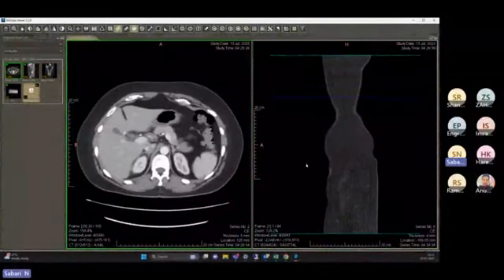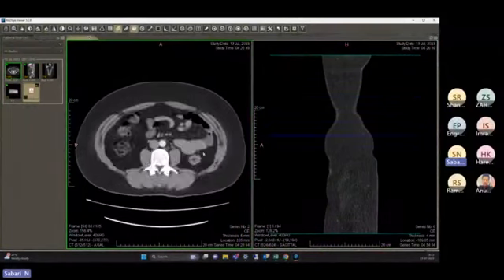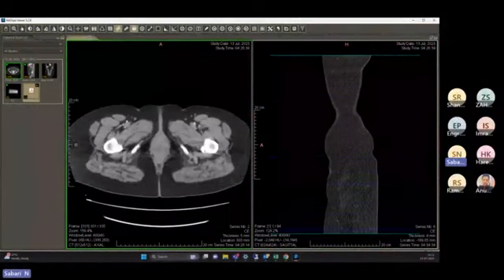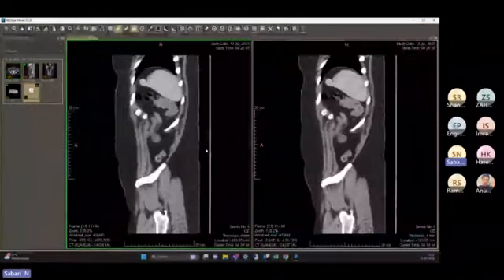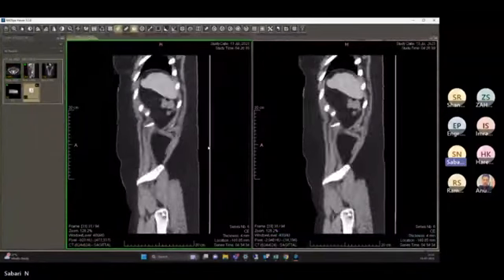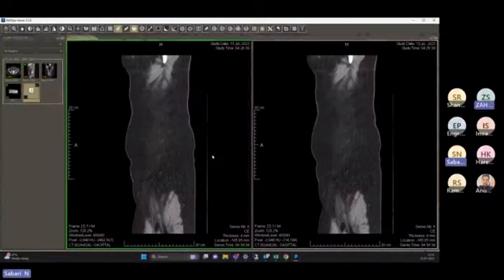Otherwise, a PDF reader would have to be installed on your PC. Unnecessarily installing a number of applications on the radiology system can make the system slow. That's the reason our application does not require any third party installation. Whatever the attachment is, it will also be displayed here.